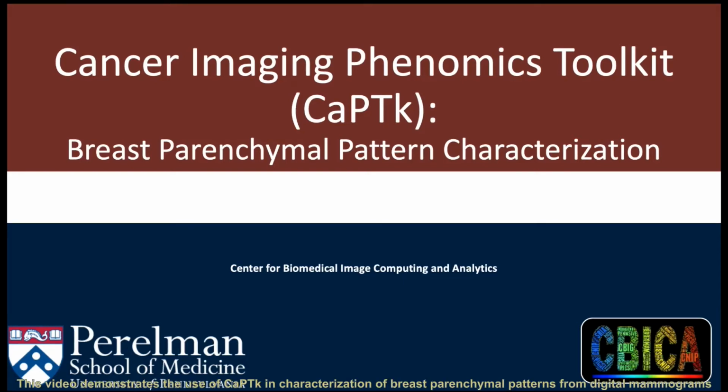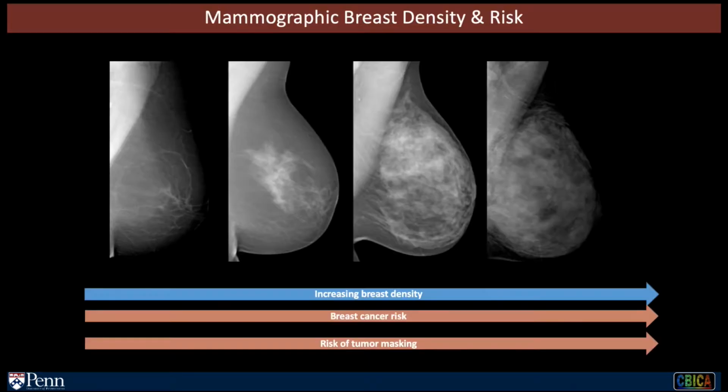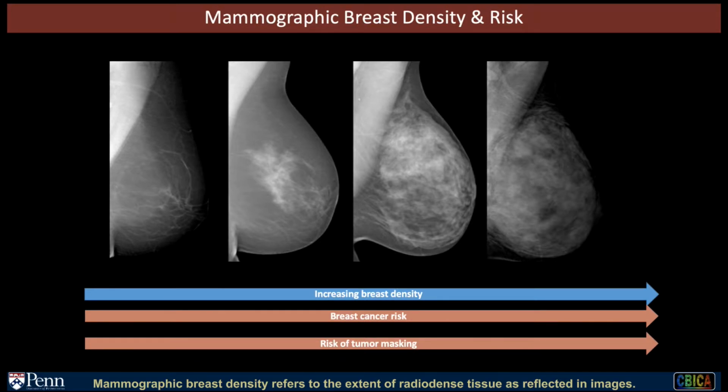This video demonstrates the use of CaPTk in characterization of breast parenchymal patterns from digital mammograms, focusing primarily on the assessment of breast density. Here you can see the graphical user interface of CaPTk.